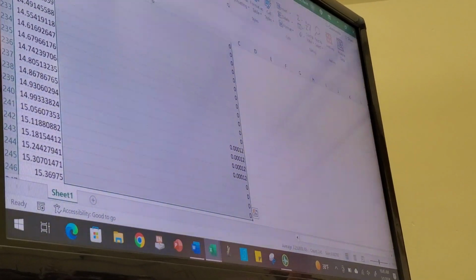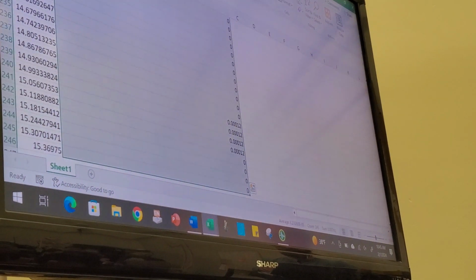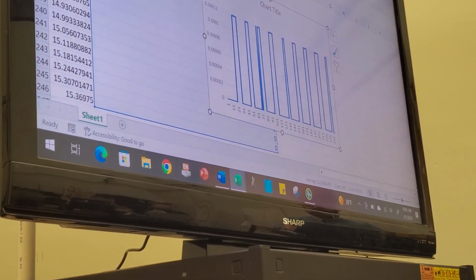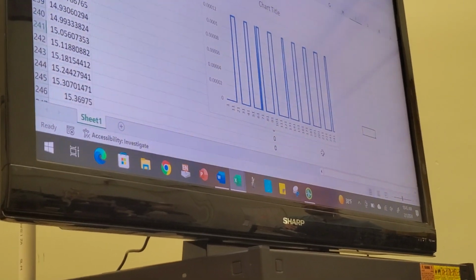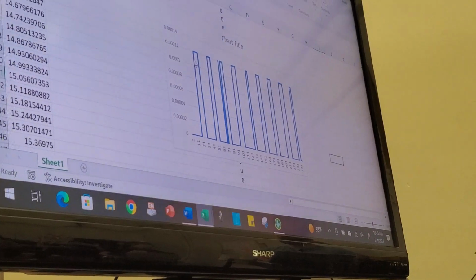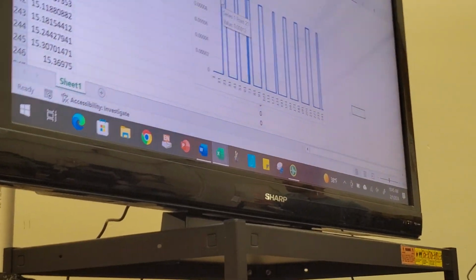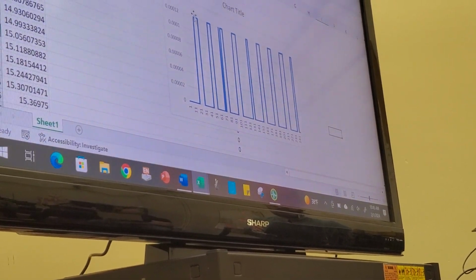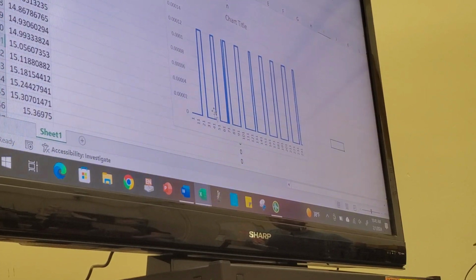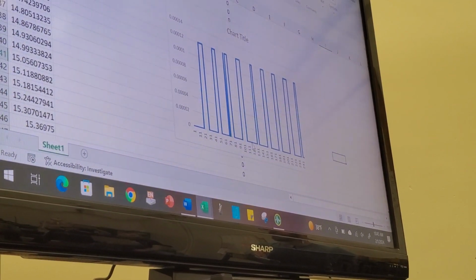It's just a binary yes or no. Either A or B. So the block means that when it's at the bottom it's deactivated and when it's at the top it's activated, right? Yeah. The vertical line represents zero time passing. So that contraction window just fits within here, and then whenever it goes back down, that means it's not contracted yet.